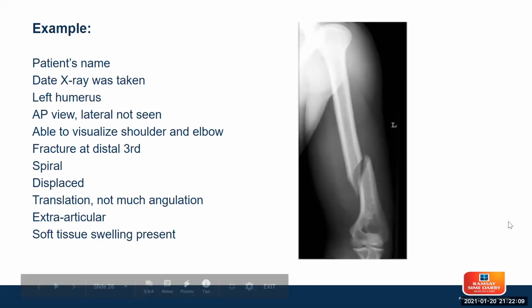the fracture. So that is basically a simple fracture and how you would present it to somebody in a more comprehensive way. Basically, there's nothing more than that you have to present when you're reading an X-ray. Very, very simple. So I have a few other examples.